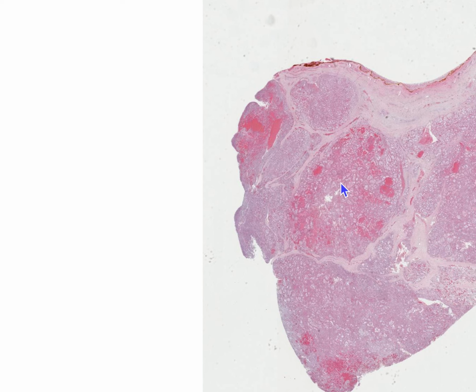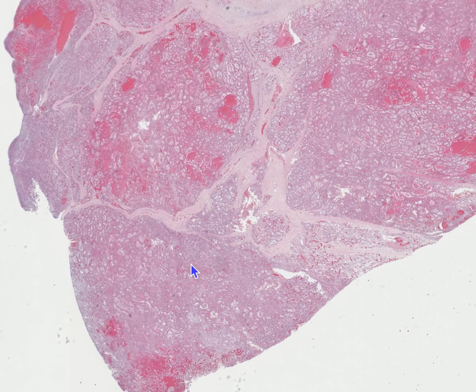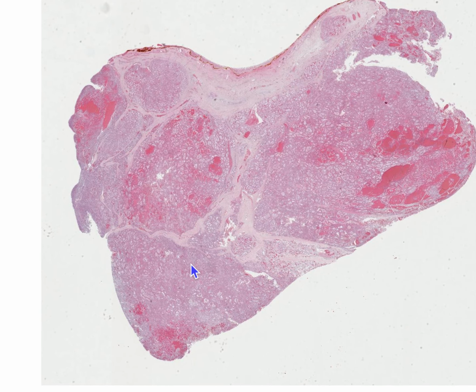Cytologically, these cells are eosinophilic, they're pink, and they have prominent nucleoli, and you can order a TFE3 and that will stain nuclear. It's important that we get clear margins, because if not, then the surgeons will resect more, and it has a propensity to metastasize to the brain.